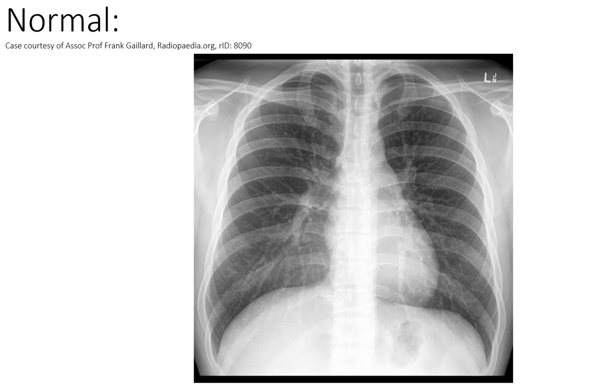But if we know all the reasons why the hemidiaphragm might be raised, then we can consider it in context. It is possible to count the ribs from the spine, and if you did do it that way, it should be 10. The problem can be that quite often you can get lost at the top, particularly if somebody's a bit kyphosed.